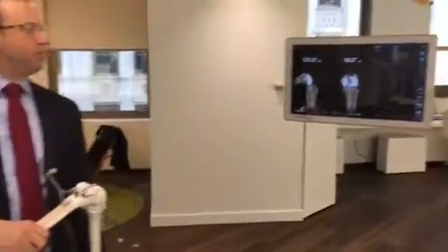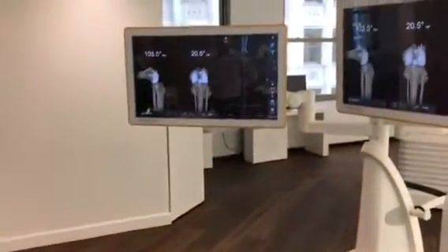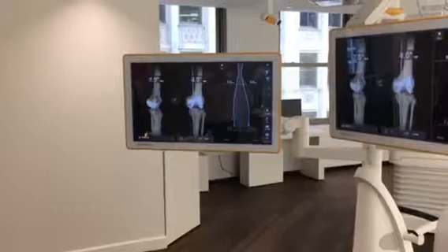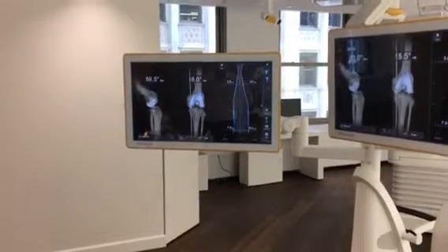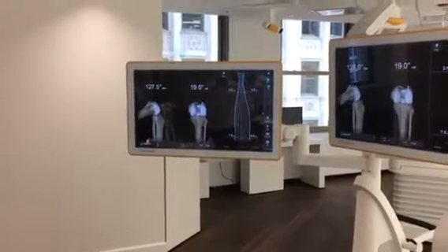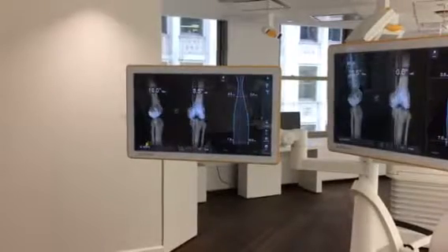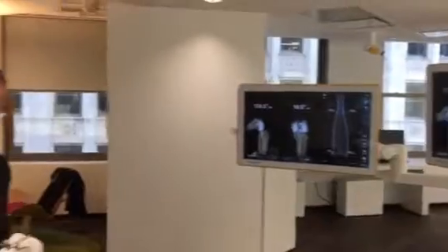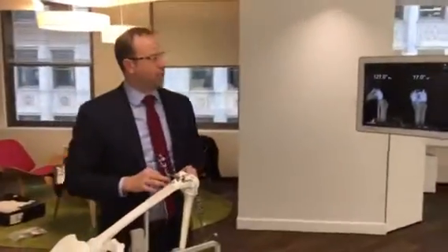After that, you've built a full model of the bone on the screen, and you can put it through entire range of motion. And as you put it through range of motion, you're building a model of what's happened in the knee. So these plastic models are pretty awful at simulating real bone.